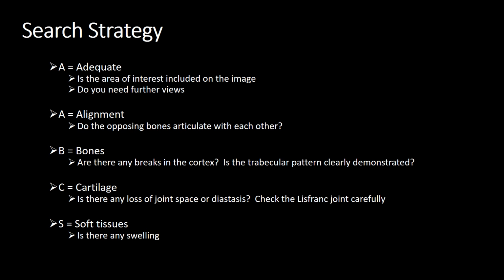And S is for soft tissues. Sometimes a soft tissue swelling can be really helpful in alerting you to the presence of an underlying injury.